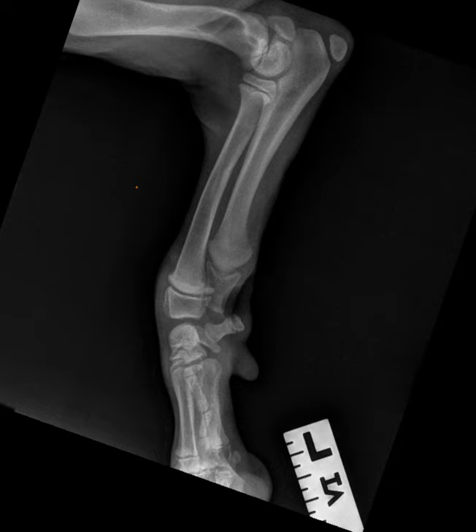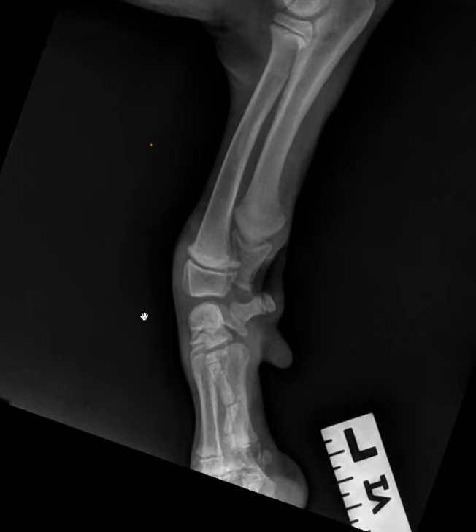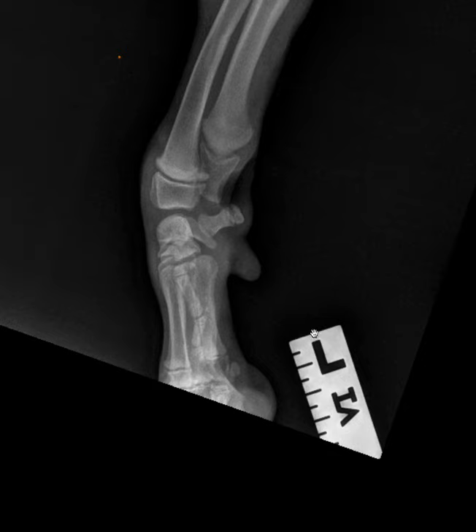Now, I'll highlight some key aspects of my approach to puppy limbs for this case. I'd like to start by saying, and maybe the right word is admitting, that looking at limbs of juveniles can be really confusing. You'll recall from last week that I like to use the ABCDs for my orthopedic cases: alignment, bone, cartilage, devices, soft tissues, and that we hope to work on each step within our It's Your Case series. Today I want to stick with B for bone, because for puppies, the bone is a tricky one because we have these physes to contend with.